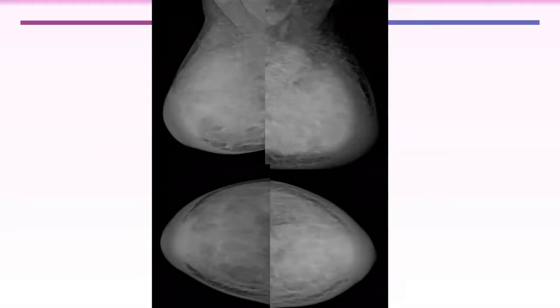Within the breast parenchyma, I couldn't appreciate any abnormality, but there is a left axillary lymphadenopathy. Excellent. There is opacity in the left axilla, mostly representing. What is next? I couldn't appreciate the fatty hilum within the lymph nodes.